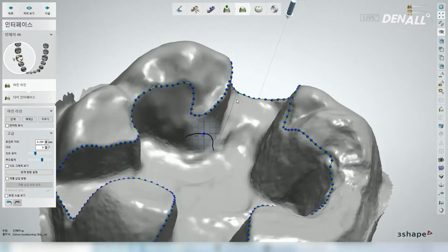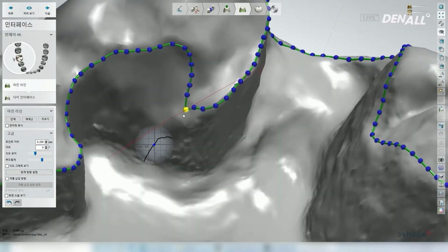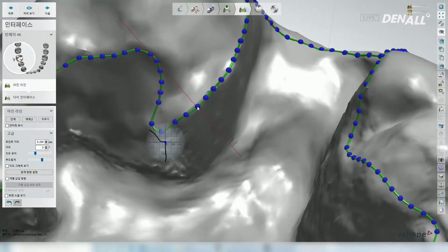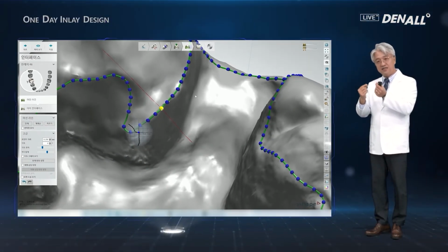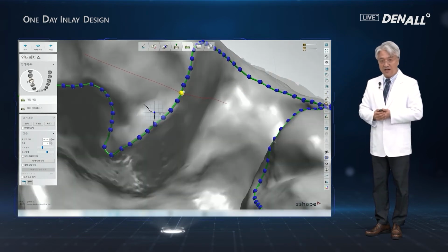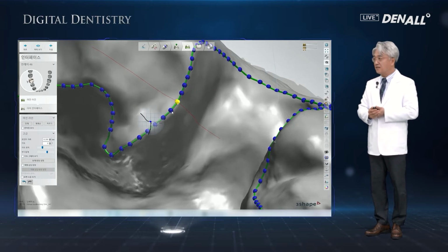And this border area, the inlay borders are like knife edge, very thin, and can be printed with the 3D printer. But in milling, if you cut, it can break because it's thin. So you have to take that into consideration in prep to have a good inlay result.